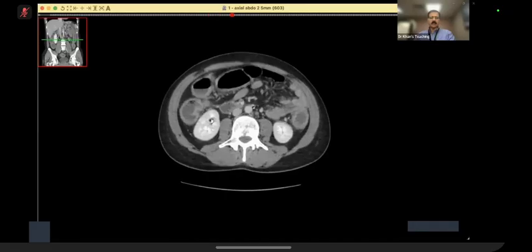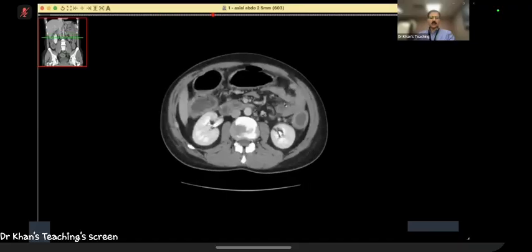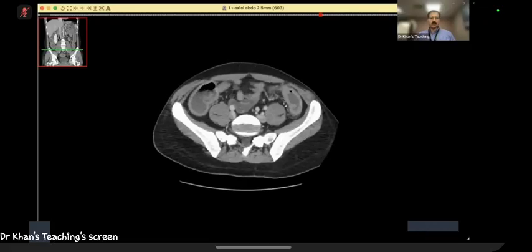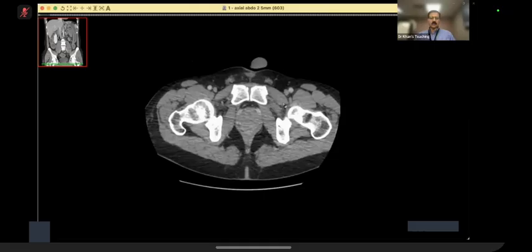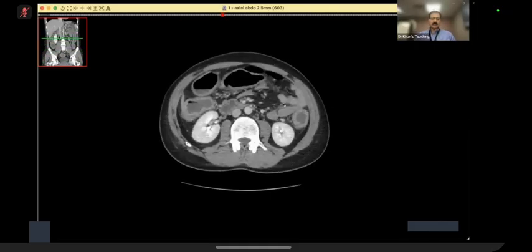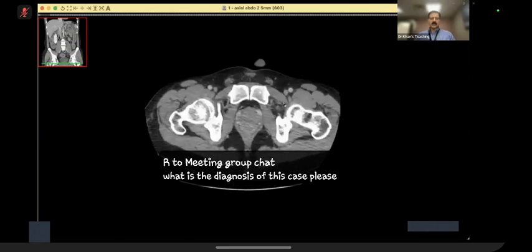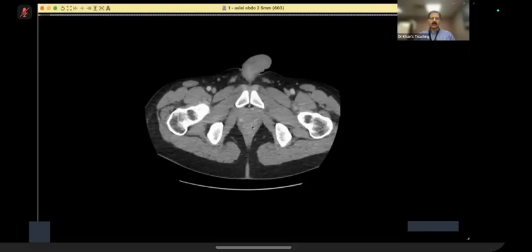A portion of the small bowel might not be very well visualized on an axial sequence, and it's standard practice to look at it on a coronal, even in the exam. In the exam, once you have seen it on an axial, you can ask the examiner that I want to see the coronal.